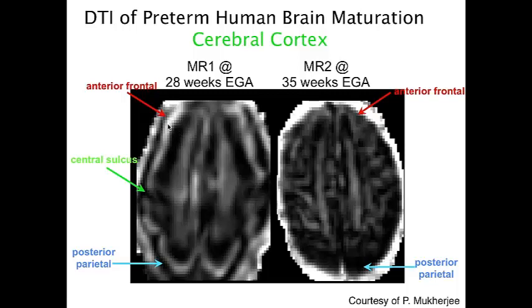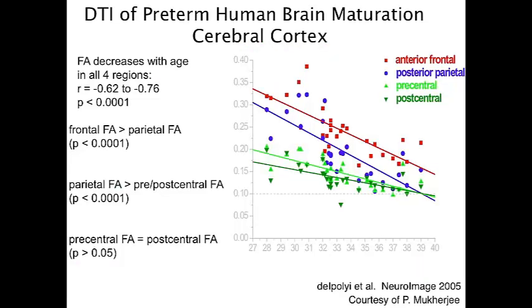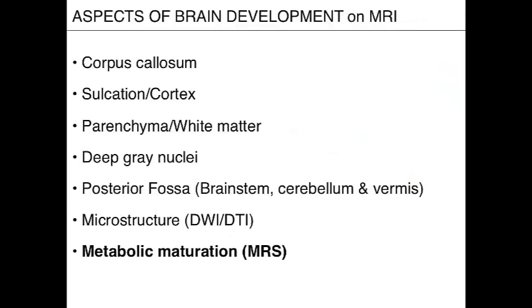So here's an anisotropy map showing you that there's high anisotropy within the developing cortex, and by 35 weeks, most of the anisotropy within the cortex is at noise level. Of note, this maturational process of loss of anisotropy within the cortex with brain maturation tends to occur first in the motor areas and visual areas before, for instance, the anterior frontal cortex. And you can look at plots of this and again, measure values, much more for research purposes.